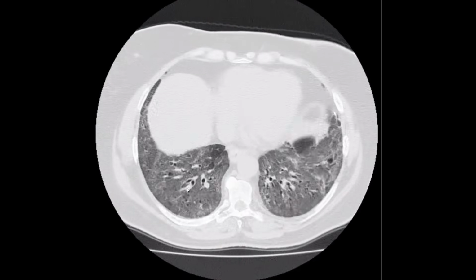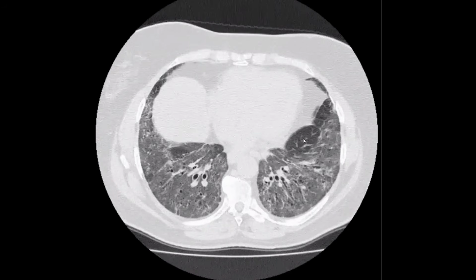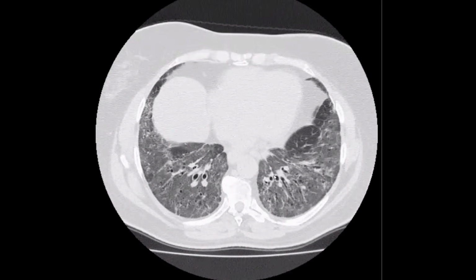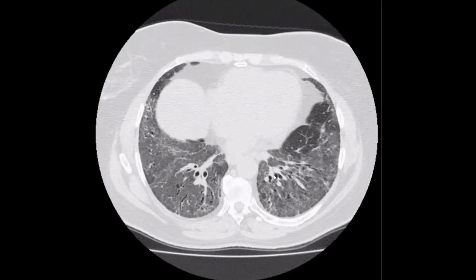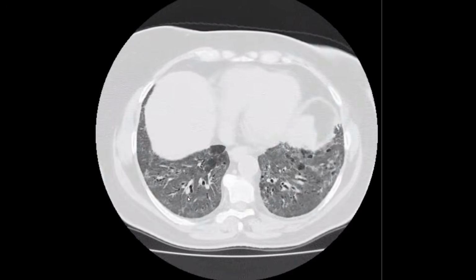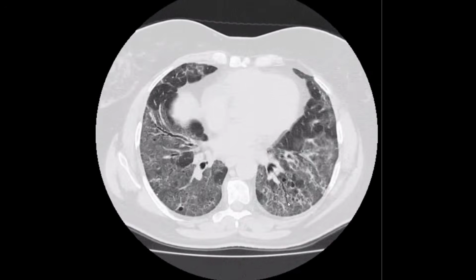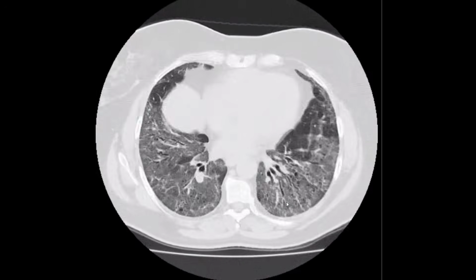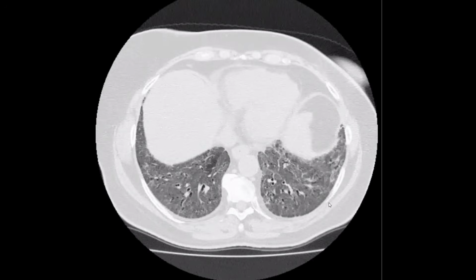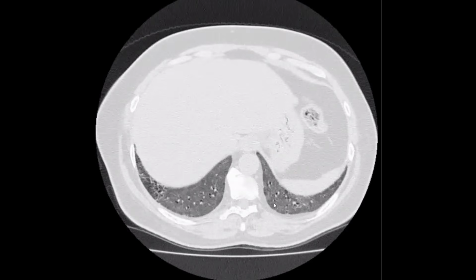NSIP. Yeah, we have two types of NSIP: we have cellular type and we have fibrotic type. If we have cellular type, the predominant features will be ground glass, like this one. So this one most likely is NSIP, and this one indeed proved to be NSIP. We have minimal reticulations, minimal bronchiectatic changes, predominant ground glass opacities, and the distribution is very important, basal distribution. Maybe we don't have a very specific sign, subpleural sparing, as we saw in the last case, but this one indeed is considered NSIP, not a UIP pattern.